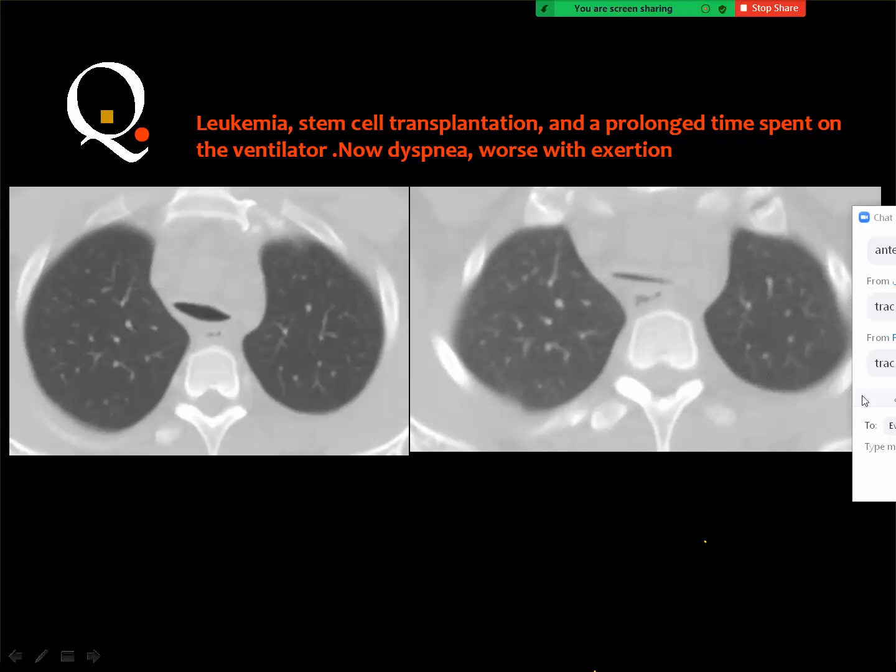Yes, this is right. Tracheomalacia, because you see the trachea has a good lumen, but it's not rounded as we used to see. And at that time, maybe during expiration, you got almost total obliteration of the tracheal lumen, and this is diagnostic of tracheomalacia.